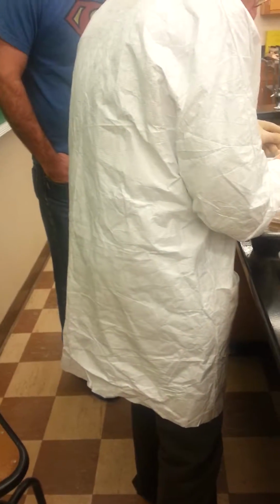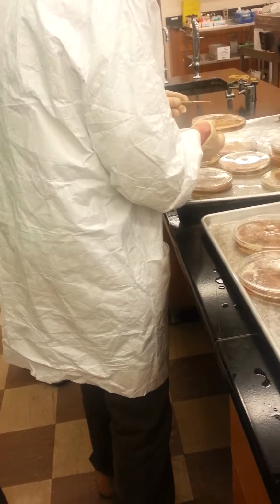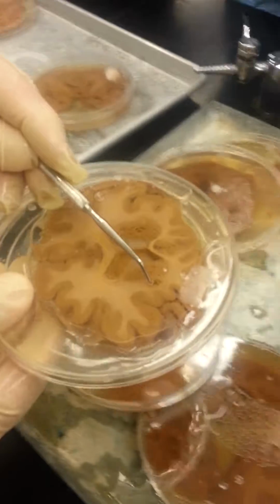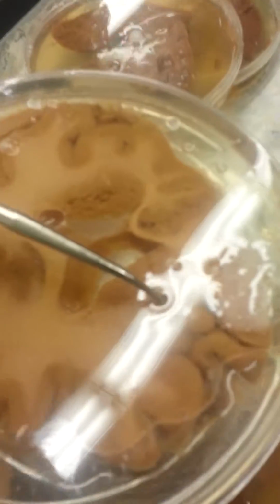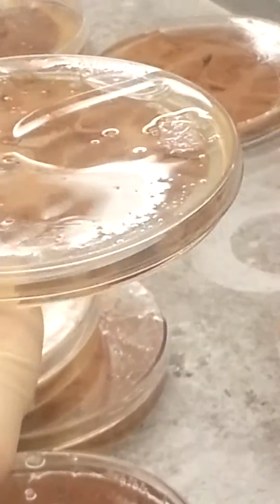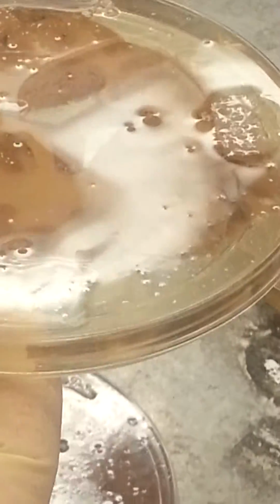See, the slice is slightly oblique, so one shows on the side. Okay, what is it? That's right. So we're just far enough back. What was the answer? The putamen. We're just far enough back so that the blade touched the putamen. So, where's the little bit of putamen? Right there. Yes, that's a bit of brown over there. Now the reason there's a slight indentation will come up further along, but I want to show that there's a certain other thing before I comment on that.